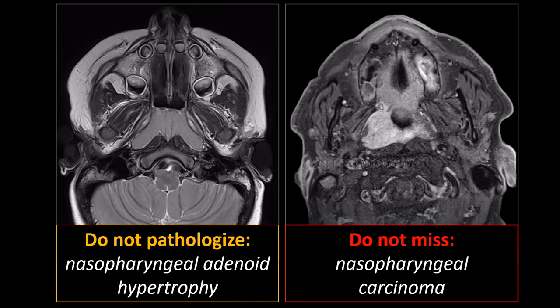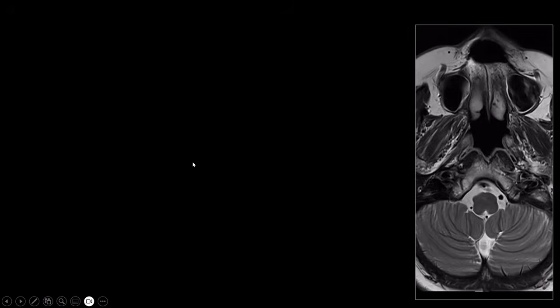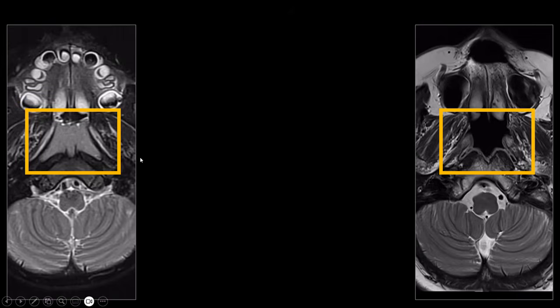And you have to be able to recognize a nasopharyngeal carcinoma, which is the most frequent tumor originating primarily in the nasopharynx. What is nasopharyngeal adenoid hypertrophy? We've seen a lot of images of the nasopharynx, and we now recognize the typical morphology of the Torus Tubarius and also the classical impressions caused on the posterior wall by the longus capitis and colli muscles.